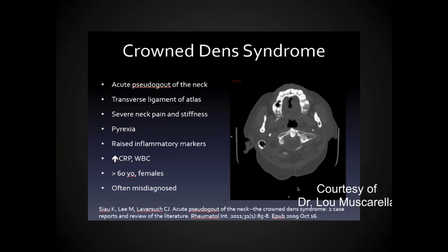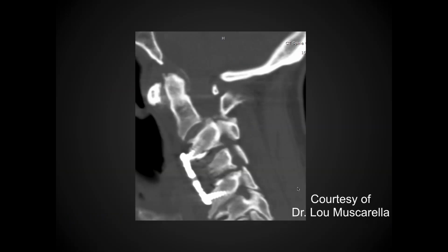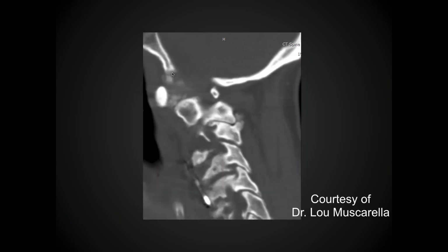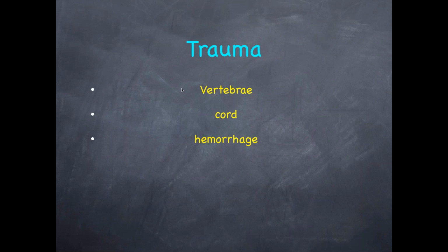What about the other images? There were other images to the side. Were those showing something related? I mean, here? And before? This just shows the calcification here, and this shows all the calcification around the dens, which is what you see in Crowned Dens syndrome. Probably traumatic. Yeah, that's what I think. Though that's not what the bulk of the literature says, but that's my guess. Like I said, 5% of the literature you can believe, maybe.